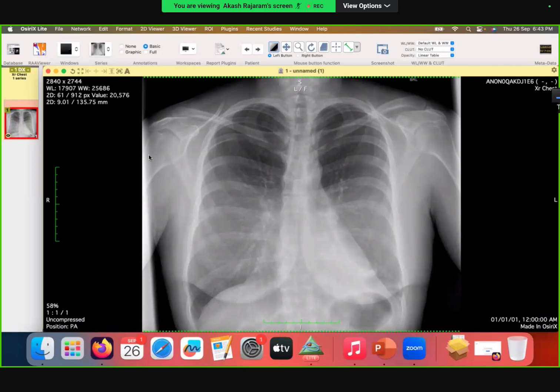Okay, trying to scan the lungs. Well, I'm trying to find if there is any oligemia, but the breast shadow is covering part. Still, the border of the left hemidiaphragm makes me concerned about left lower lobe abnormality. That might be the cause of pleuritic chest pain if it is on the left side. Usually, pleuritic pain would be localized.